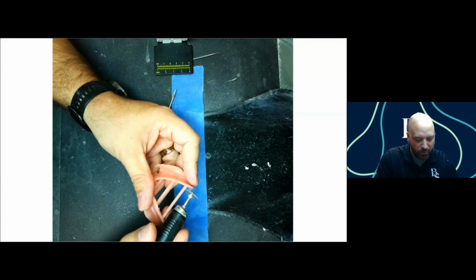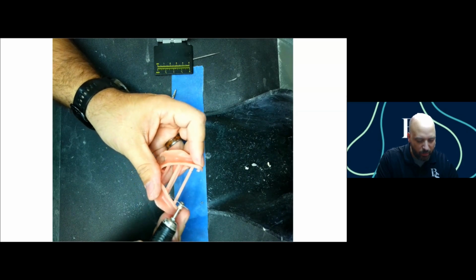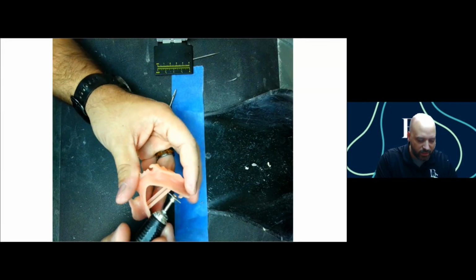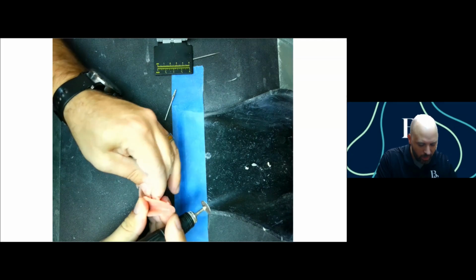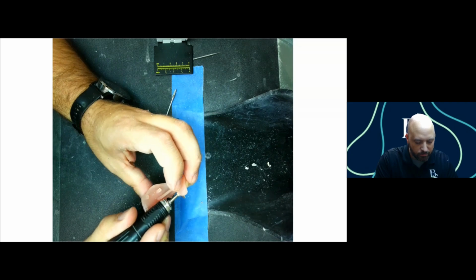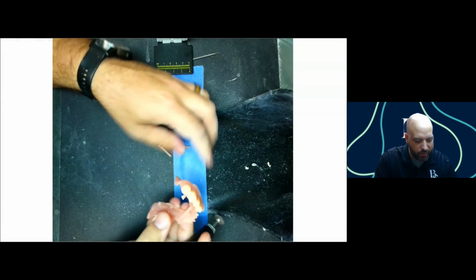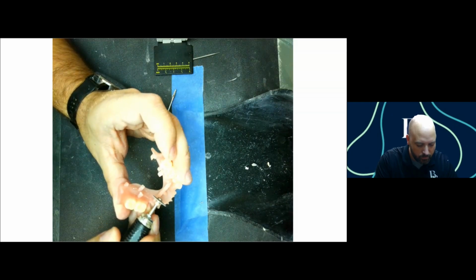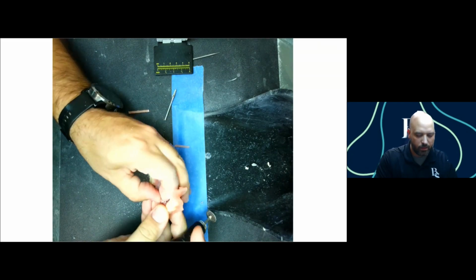I usually get them about 3/4 of the way, and then I just kind of break the rest of the way off. So this material comes apart real nice and easy. And don't worry if you can't get super close to the base like I couldn't there. When I finish these down, they'll finish off real nice. So I got all those off.